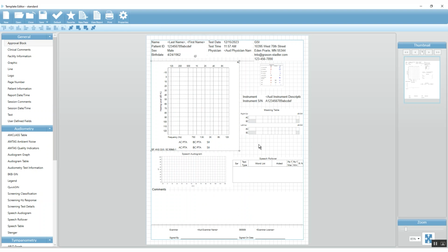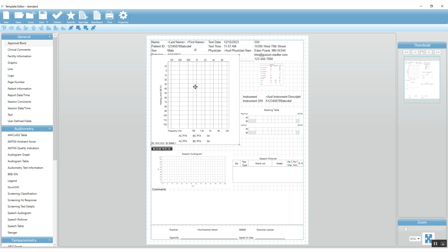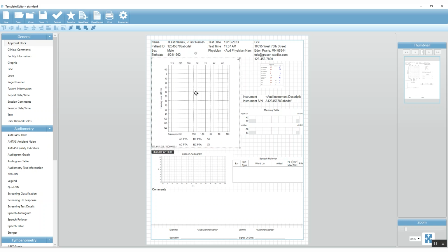The second thing that I want to make mention of is that we have two separate distinct areas of the template. We've got a header and a footer. So we've got the top title stuff on top, and then the footer down here with our signature. The middle section, anything in this middle section here, we want to make absolutely certain that it's not touching the header or the footer.